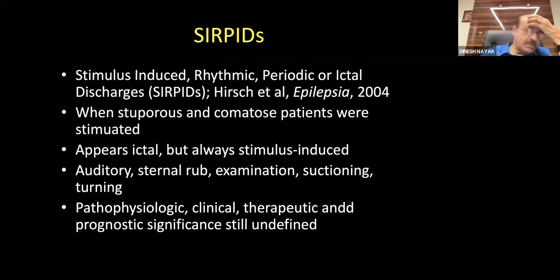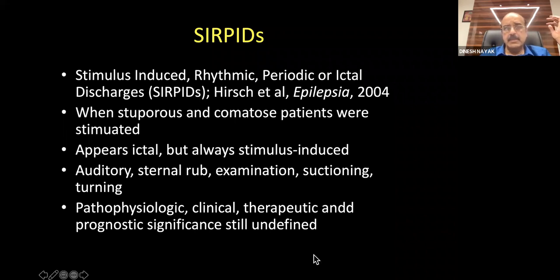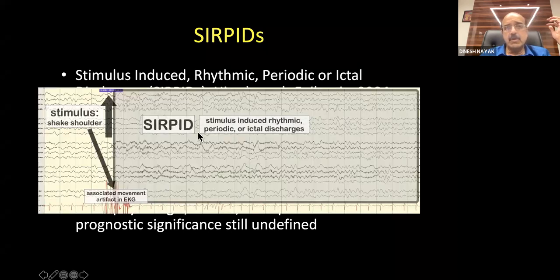That's what is called stimulus-induced periodic discharges. We still don't know what it means. I don't have a good example, but this is how it will look.